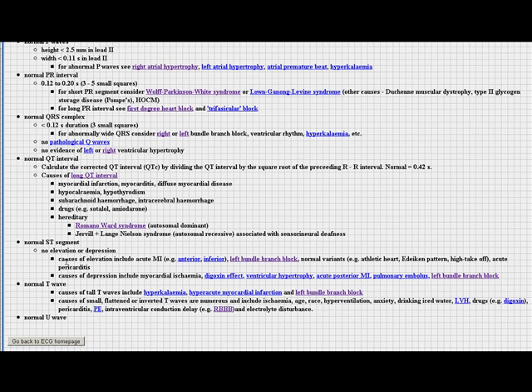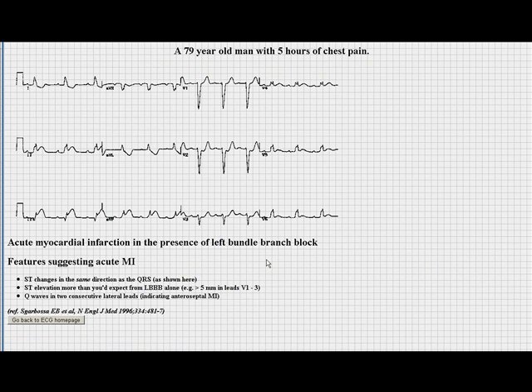Now I'm going to do these two together, normal ST segment and a normal T wave. And basically what you're looking at out here is the process of repolarization. So here we've got kind of an abnormal repolarization, or it's even more evident right here. We have a depressed ST. This would be S and T. And what this would indicate, and there's another video on this, it's called stress test or treadmill test, is that the heart is changing its path of repolarization.